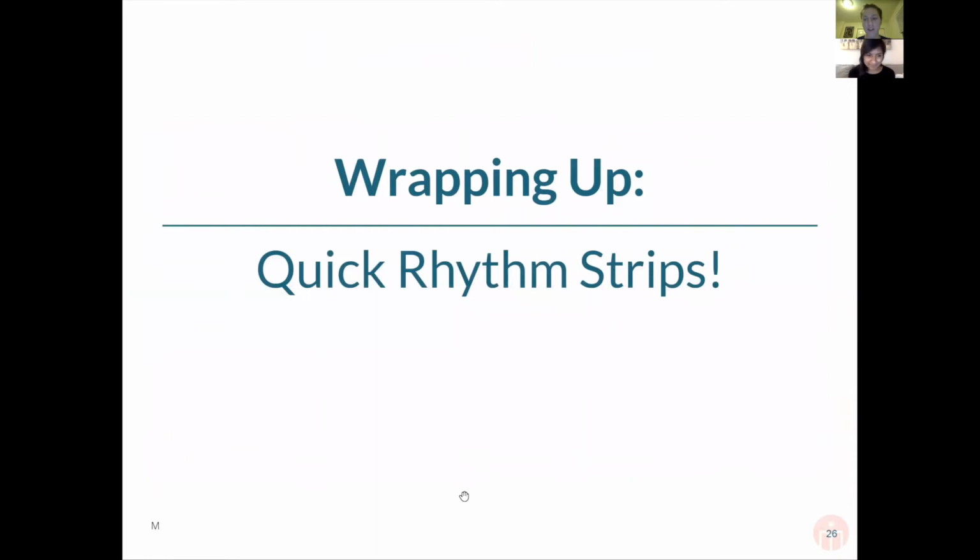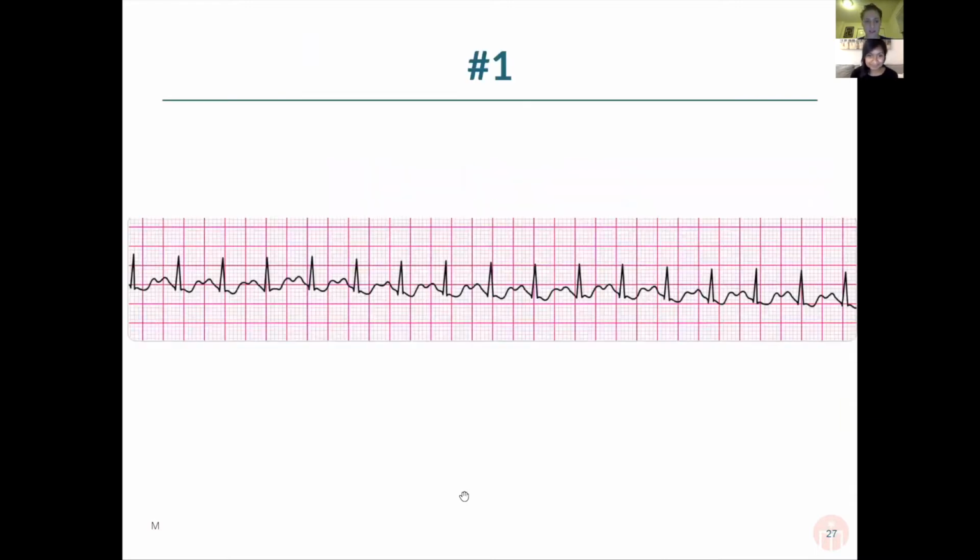Okay, guys, so get ready to fire your answers because we're going to go through some rhythm strips and we're going to throw them up on the board and you can kind of see them. All right, so first one, take a look, see what you see here. Try and go through, again, you're not going to be able to do it as systematically because these are rhythm strips, so more of a gut reaction, what's jumping out at you.